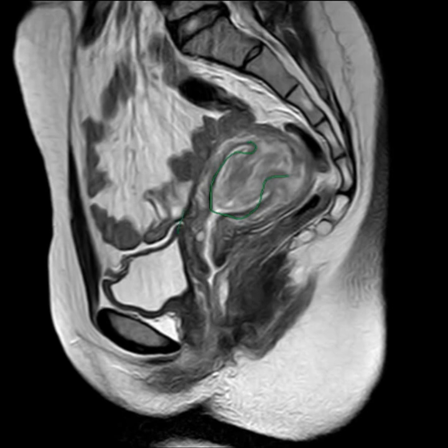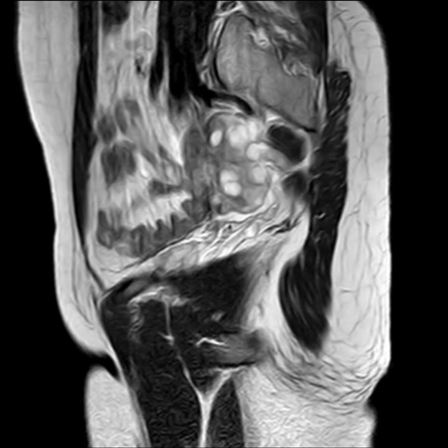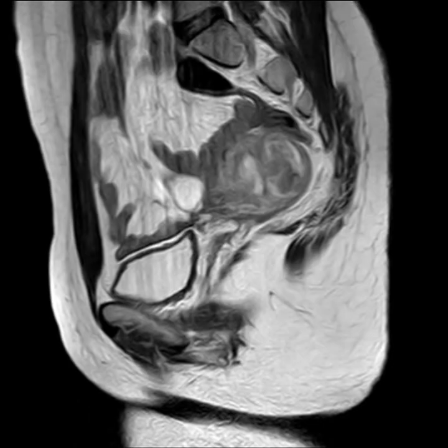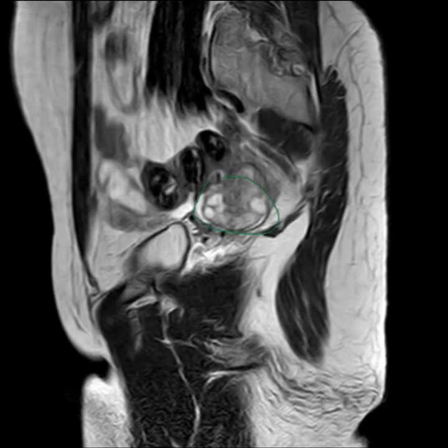Of course, the uterus here is retroverted, and I think this is the ovary, and as we can see, it's big. It contains multiple peripheral follicles. If you look at the other side, we can also see the same feature. It's a big ovary with multiple follicles, so probably this is just part of polycystic ovary syndrome.